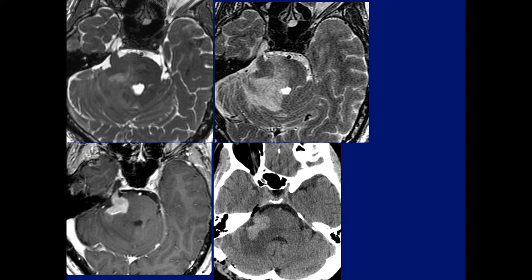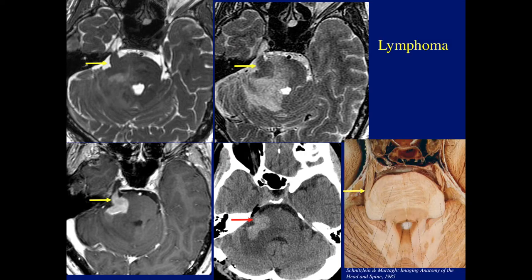A schwannoma is unlikely to enlarge the nerve and the pons to that degree, although it's an interesting possibility. Correct. Asif mentioned the correct diagnosis here. This was lymphoma, extensive lymphoma involving the pons and spreading into the trigeminal nerve.